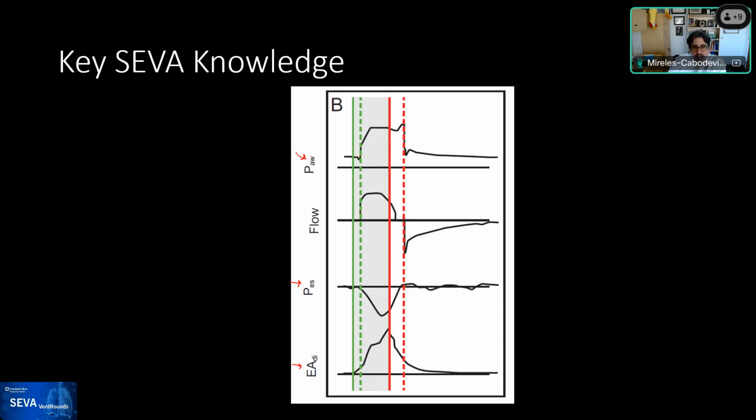And then for cycling, or the end of the breath, you can see that you reach a peak on the electrical activity of the diaphragm, which may not match the peak of the drop in the pressure in the thorax. And this we can consider that the muscle, even though the brain is sending a signal, the muscle cannot contract more, and so it has reached its maximum that it's going to contract. So there's some level of neuromechanical uncoupling that occurs on those levels, and you will see that the pressure waveform and the flow waveform will lag behind where the breath ended.